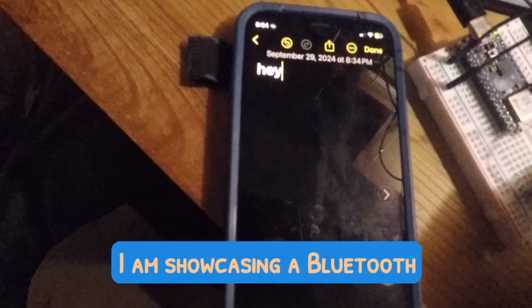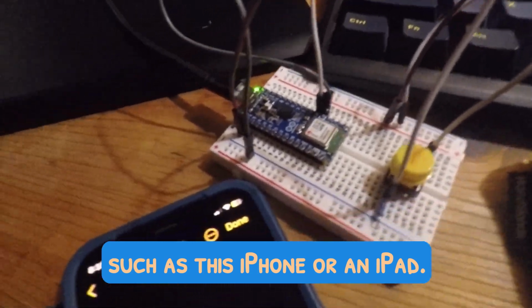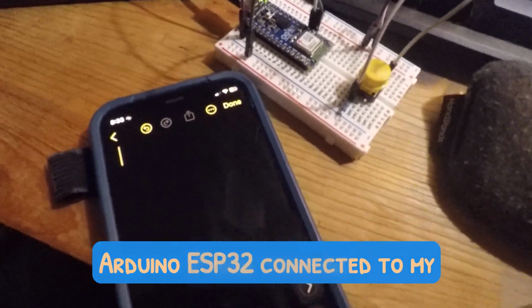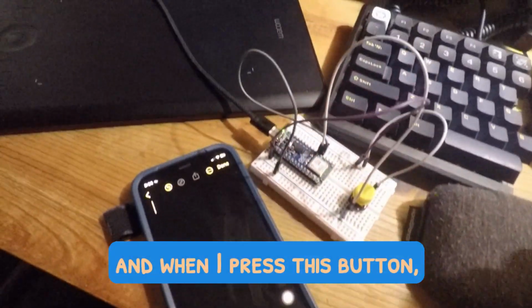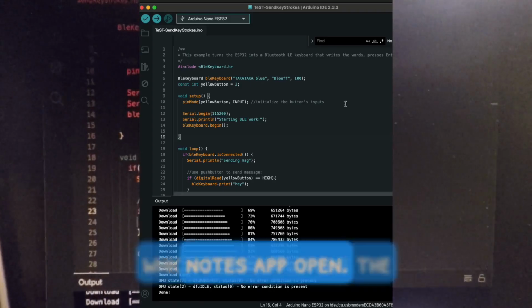In this video, I am showcasing a Bluetooth-enabled keyboard controller for any device that accepts Bluetooth connection, such as this iPhone or an iPad. Current setup shows an Arduino ESP32 connected to my iPhone through Bluetooth. On this breadboard, the ESP32 is wired to a yellow tactile push button, and when I press this button, it sends the word "Hey" to my phone, which currently has the Notes app open.